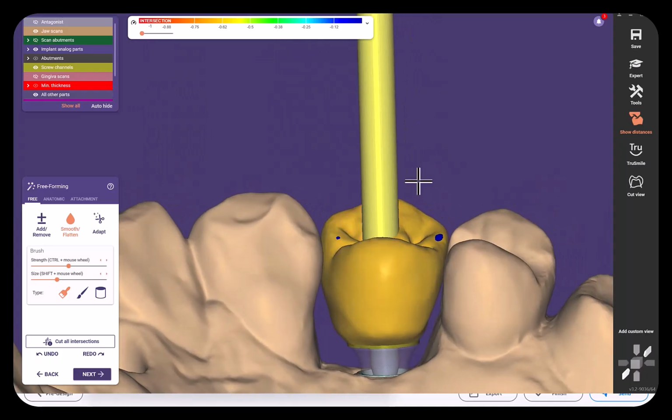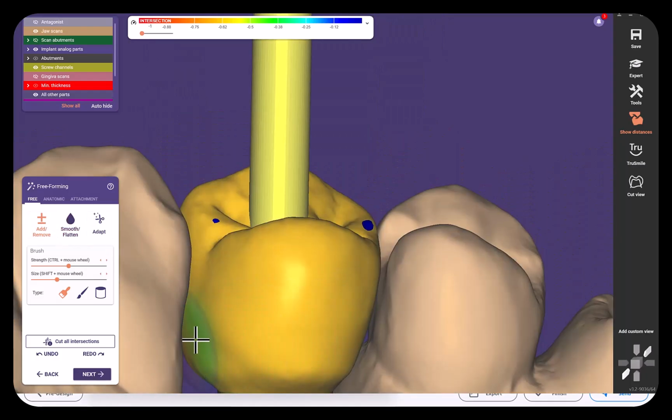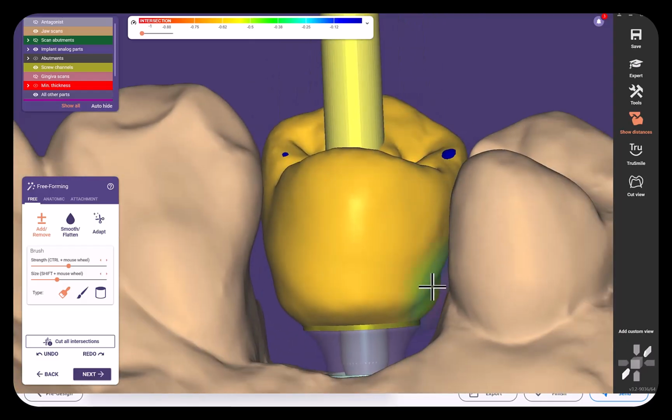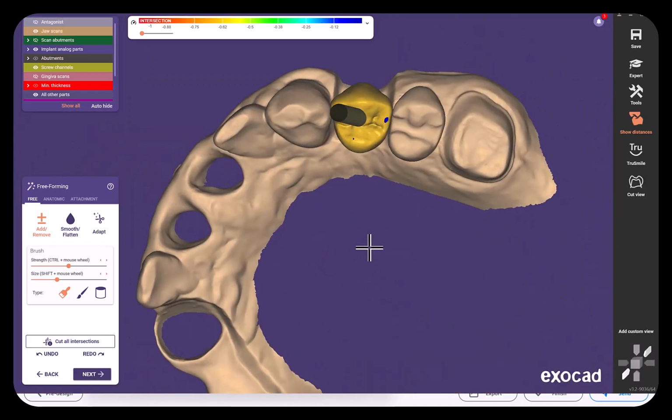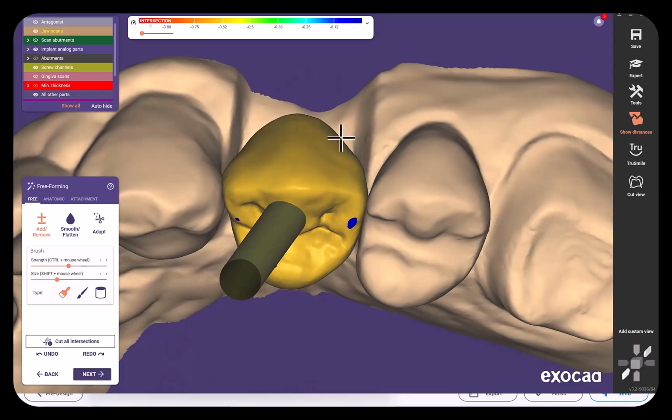And so I'm going to fatten this up a little bit down at the emergence. I'd rather fatten it a little and then smooth things out to make sure I've got a really nice profile. You see how that's a bit rough? I don't love that. So looks a little skinny in these areas, so I'm going to fatten that up as well.